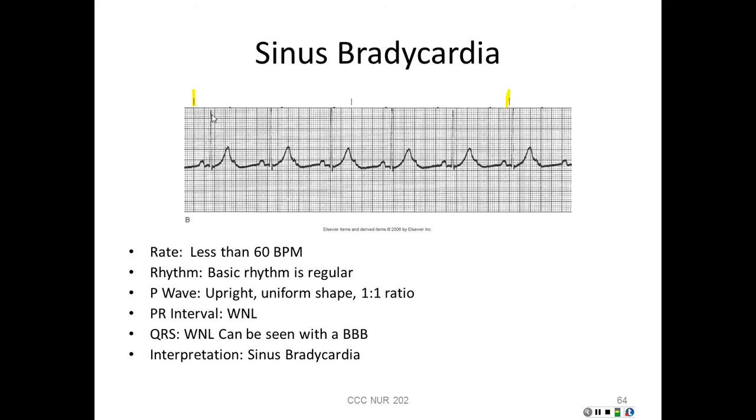If we checked our rhythm, we marched it out, our rhythm is regular. We looked at our P waves, they're present, they're upright. There's a P wave for each QRS, a QRS for each P wave. Our PR interval is going to be about 4 blocks, maybe 4.5 blocks, so 0.16 to 0.18 seconds. Our QRS is a little bit narrow. It's 1 block. It's about 0.04 seconds. That's okay. And as we look at this, we see that this is a slow rate.